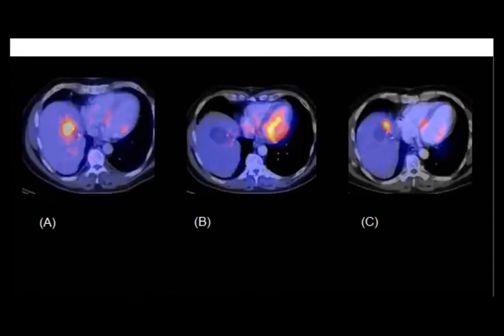HCC. Yeah, hepatocellular carcinoma, perfect. So hepatocellular carcinoma will be the HCC, doc, perfect. And after he did the radiofrequency ablation, what happened here?